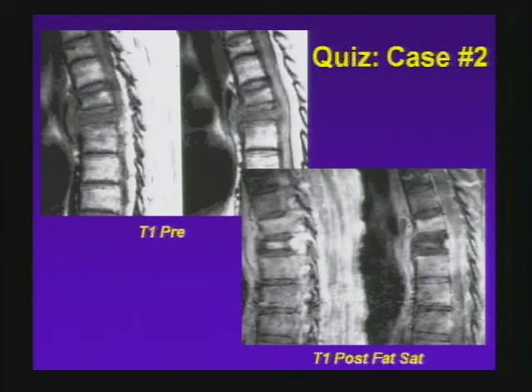And if you want a history, this is actually a twin of patient number 1. So it has identical medical problems and history, and you can assume that for the remainder of the cases. So I'll just send the little arrows out for you to look at some of the key features. And I want you, just a few more seconds, to put N, I, or O down. You know, when I used to sit at these sessions, I would just sit back there and say, oh yeah, I would have said that. But sometimes that wasn't the case. So anyway, here are the features.